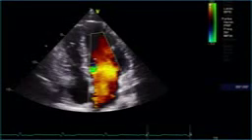We've covered mitral regurgitation in the previous chapters. Here is a very short review of what you've learned so far. Red would mean flow towards the transducer, and blue away from the transducer. The lighter the colors, the higher the velocity. And if the velocity exceeds a certain limit, then we get a mosaic or a mixture of different colors.